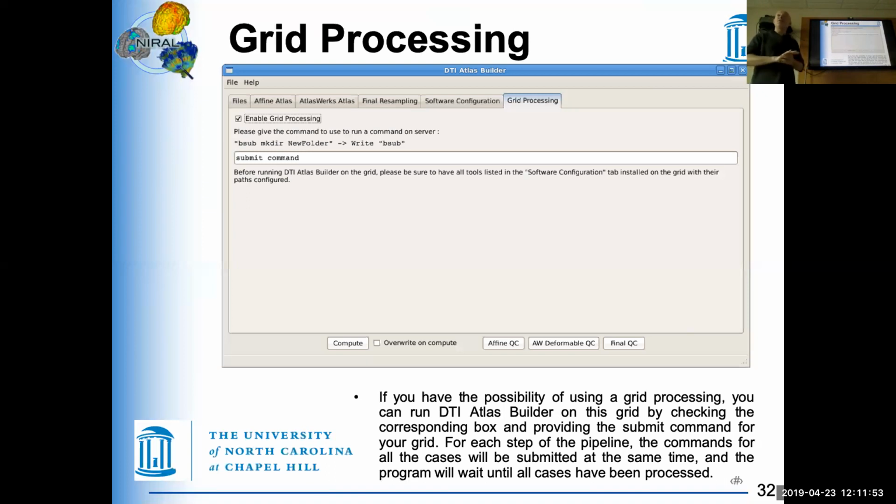One last thing, if you want to do TBSS with FSL, I suggest you do not use the atlas creation in TBSS. I suggest you use this, because that creates deformation fields that are readable by FSL. And it also creates an atlas that is of much better quality than the FSL atlas. There's actually a very nice paper out, not specific to our DTI AtlasBuilder, that shows that FSL's atlas building is a bit wonky. So you could also use the one that comes straight with ANTs if you want to do that. It's definitely much better.